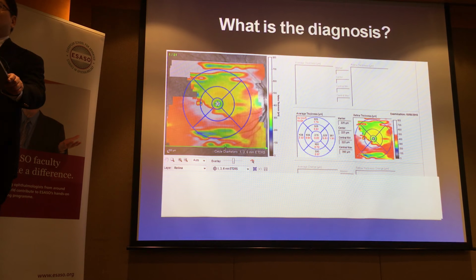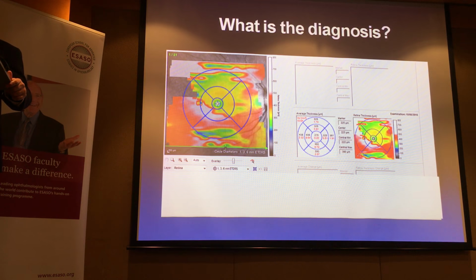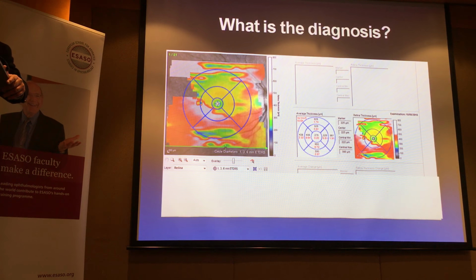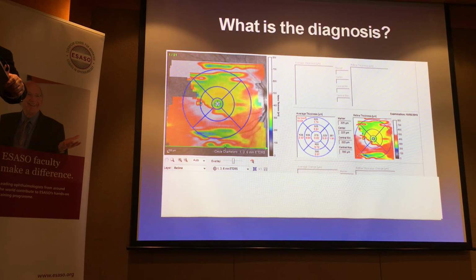Can I get someone brave to shout out the diagnosis in this case? What does this patient have? And by the way, it may not be PCV. I know I'm keen on PCV, but during the recent exams, when we took our residents for exams, I described a viable scenario. I described this patient comes with chronic blurring of vision for 6 months, and the first diagnosis some of them rattled out was PCV. I said, look, just because it's me taking an exam doesn't mean the answer is PCV. It was a macular hole. So anyway, someone? It could be PCV though. Who knows?